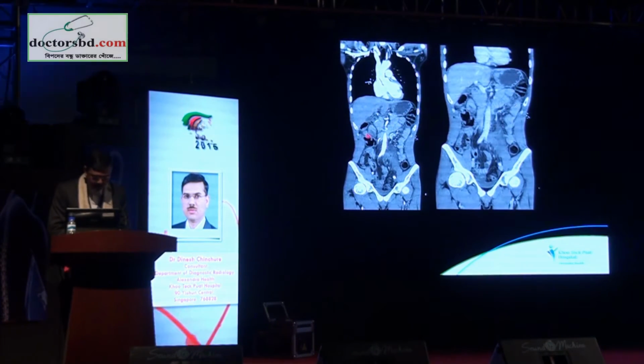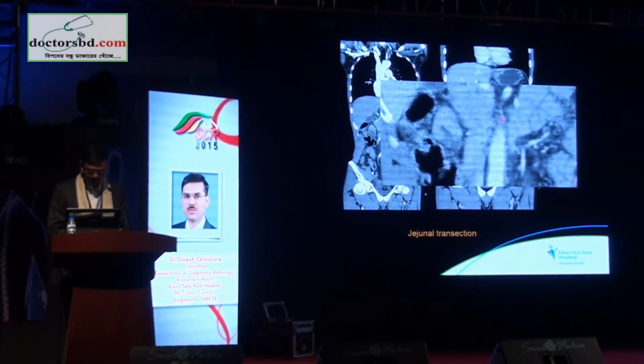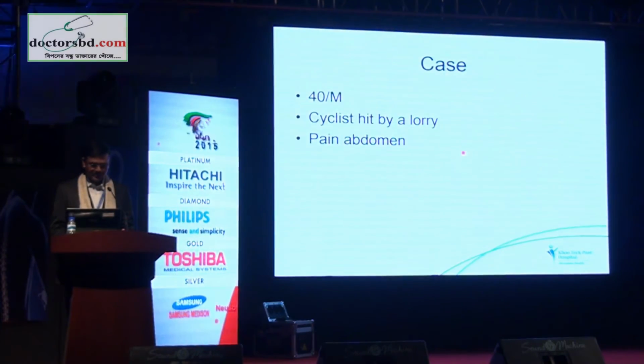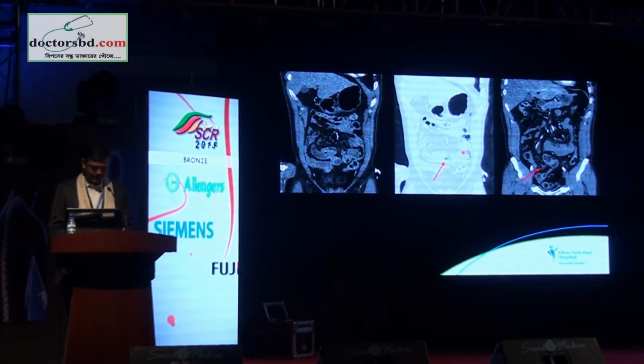You can see this here, enhancement and no enhancement. If I zoom, you can see there is an enhancing loop of bowel and it doesn't enhance. So this was a jejunal transection on surgery. A 40-year-old man, a cyclist hit by a lorry.